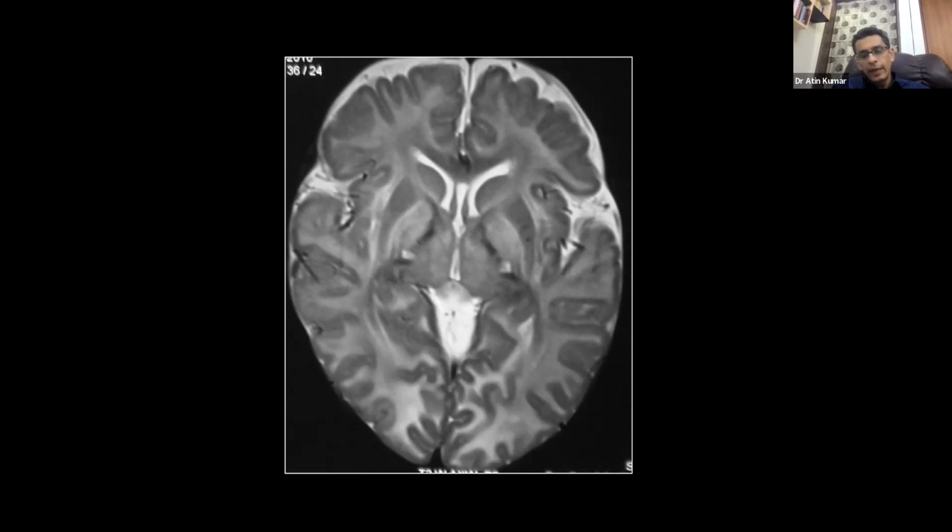And that's because of the underlying enzyme abnormality. When you have accumulation of N-acetyl aspartate, that's what leads to the same thing being seen on spectroscopy as elevated NAA, whereas most of the other abnormalities will have decreased NAA because of the neuronal loss. So that's what I wanted to highlight.